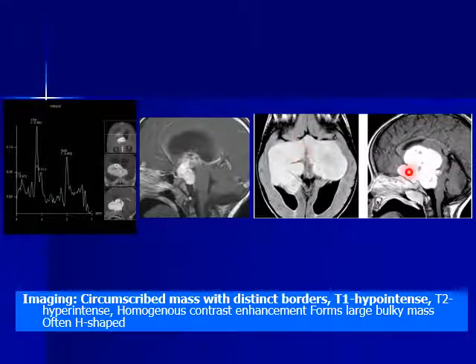The lesion appears as a suprasellar mass that infiltrates the hypothalamus and the chiasmatic region. It is seen as if it is cystic because it appears very bright in T2 and FLAIR, okay? But after contrast administration, it avidly enhances. This is very characteristic for this lesion.